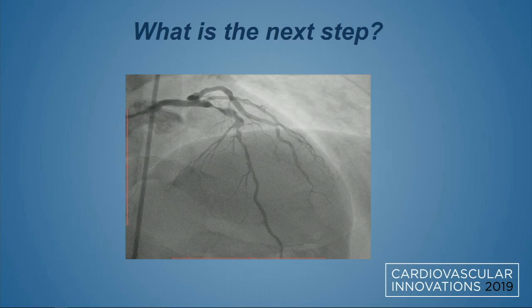But then it's probably going to occlude. Yeah, it's going to thrombose, and there are still residual significant lesions there. Also, the patient has a family history that his father died at 45 years, so this may be something genetic. Possible. This may also suggest that it's an aneurysm, not a dissection.